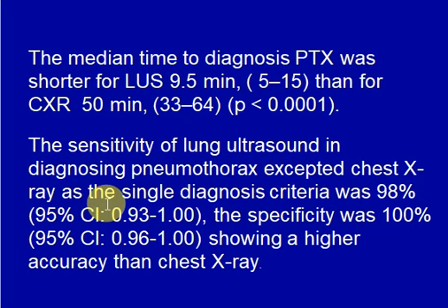So by the end, the normal lung ultrasound findings will be a normal pleural line, lung sliding, which is very important, and A line. By M mode, there is the seashore sign. In pneumothorax, because of the air, there will be a lot of A lines and a normal pleural line. The only difference is lung sliding. In the normal lungs, there is lung sliding. In pneumothorax, there is no lung sliding, with the barcode sign in M mode.